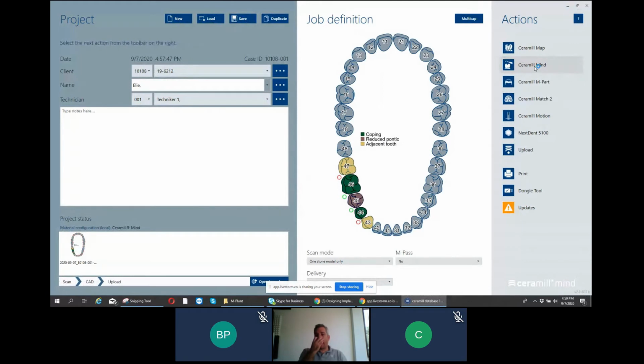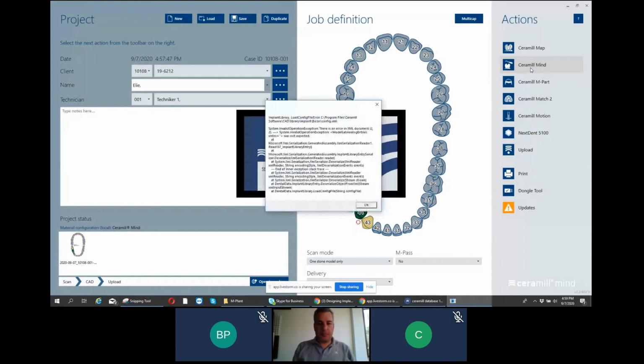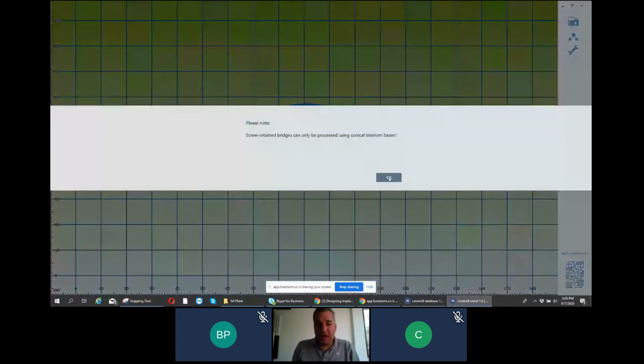I will not scan. I will show you how to do the design. Because I don't have the files, we need to import the files.